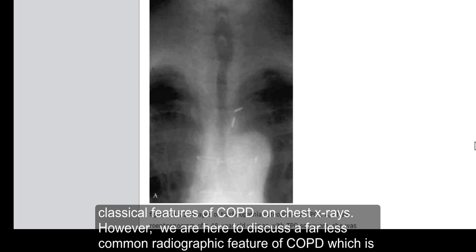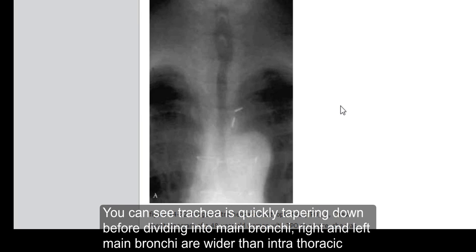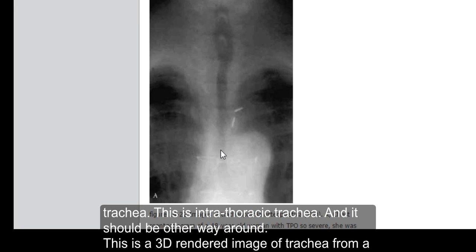However, we are here to discuss a far less common radiographic feature of COPD, which is known as Sabre Sheath Trachea. The word sabre actually refers to a sword, which is the reason behind such name, I presume. You can see the trachea is quickly tapering down before dividing into main bronchi. Right and left main bronchi are wider than the intrathoracic trachea. This is the intrathoracic trachea, and it should be the other way around.